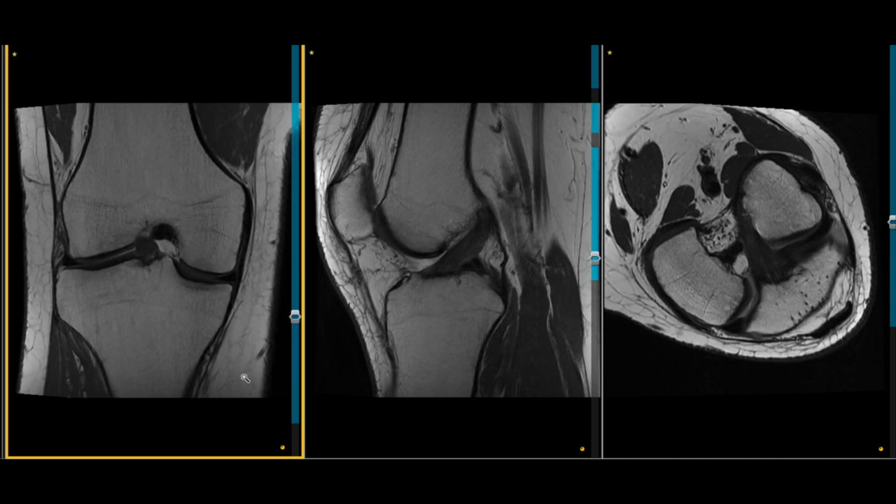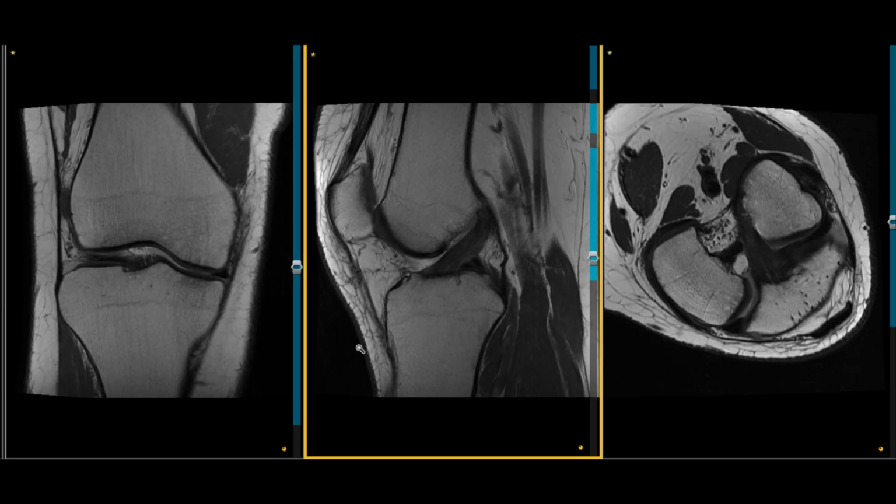length. Then you go through to the sagittal sequences to assess the trajectory of the ACL, and on these sagittal sequences you can see that the ACL again appears to be of uniform signal but also of uniform thickness and is parallel to Blumensaat's line in a normal taut configuration compatible with the normal thickness taut ACL healing.